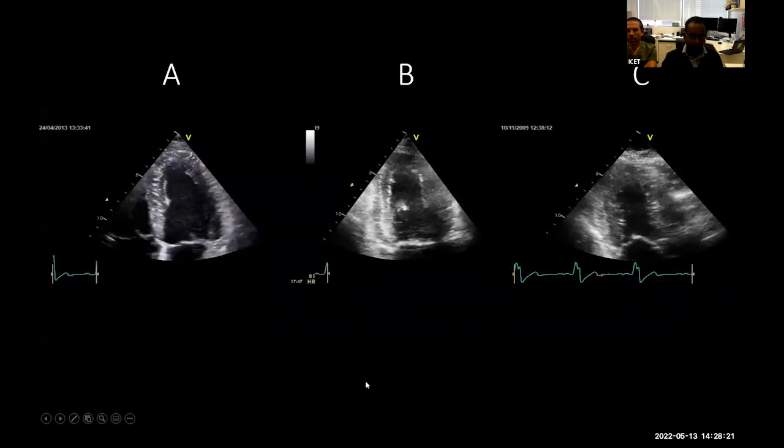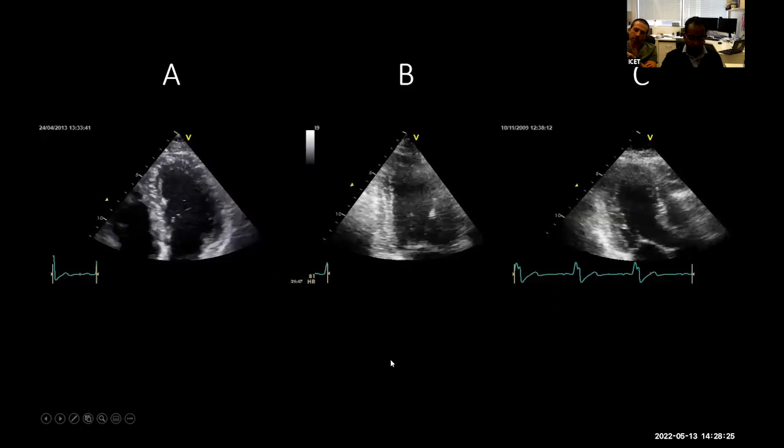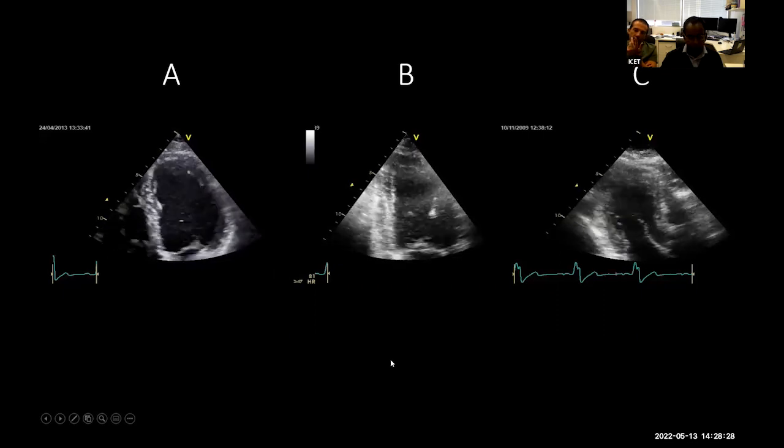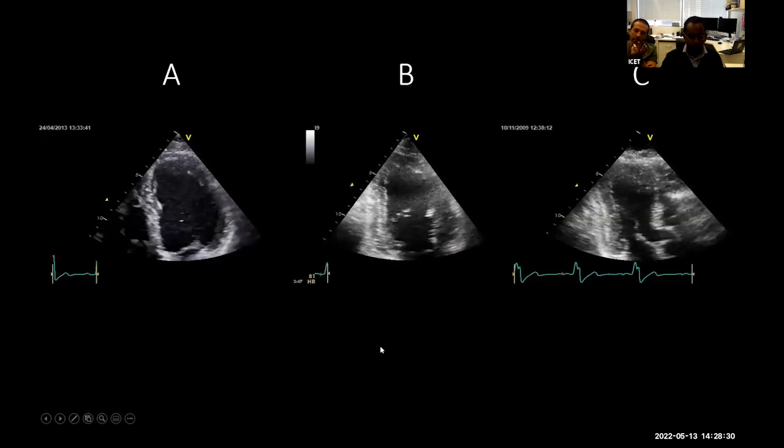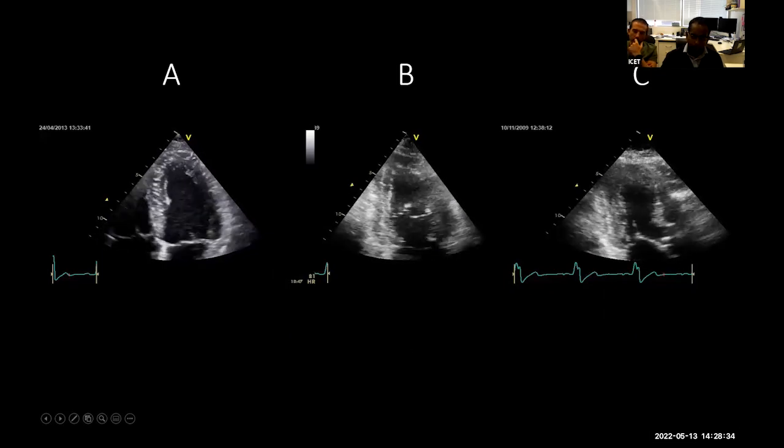And what about panel C? I think the danger in panel C is you've got loss of the blood tissue interface at the apex, and it's like two continuous segments, which makes it harder. Yeah. Again, you can do the same thing. You can try and manipulate the software.